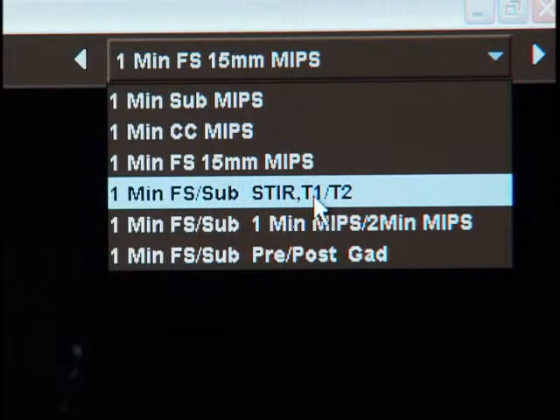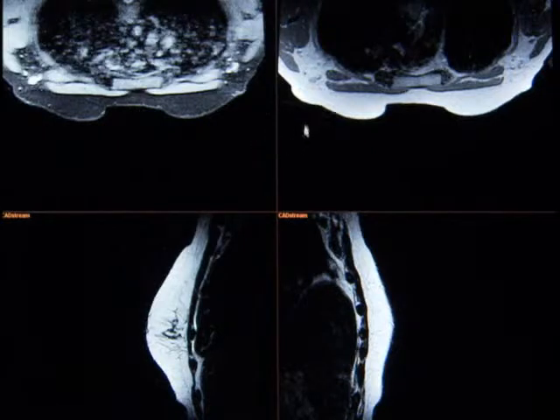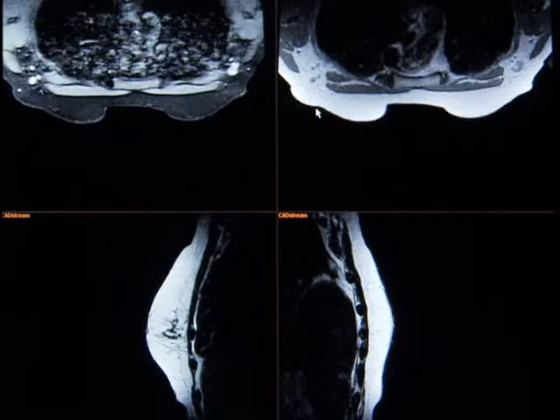Our next pull down evaluates the raw data with multiple pulse sequences. It's at this point that we generally begin our dictation, looking at the right-handed screen where we're evaluating our STIR pulse sequence and a T1 high-resolution pulse sequence. In this sequence, it allows us to start first looking at unenhanced imaging data, evaluating our STIR sequence linked to our high-resolution T1 sequence.